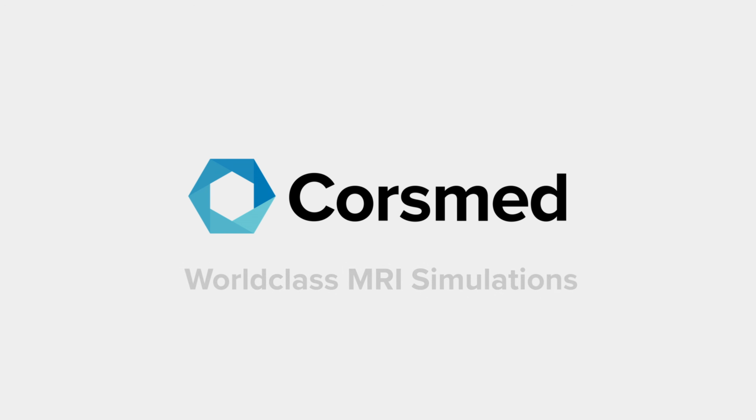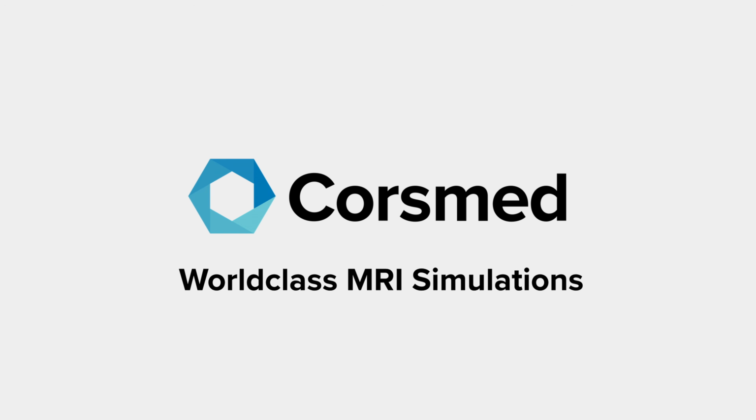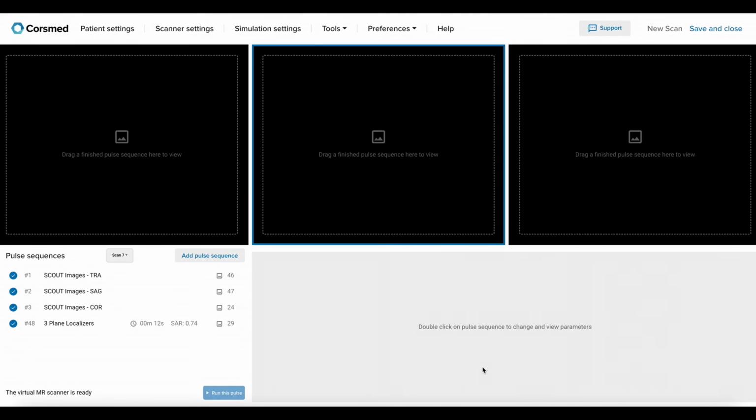Today we're going to do the lumbar spine protocol. I'm going to take it step by step at a nice slow pace and make sure you get every image of high quality. I'm going to swap over to the MRI simulator and we'll get started. Here we have the Corsmed MRI simulator, which is where I will demonstrate how to run this protocol.